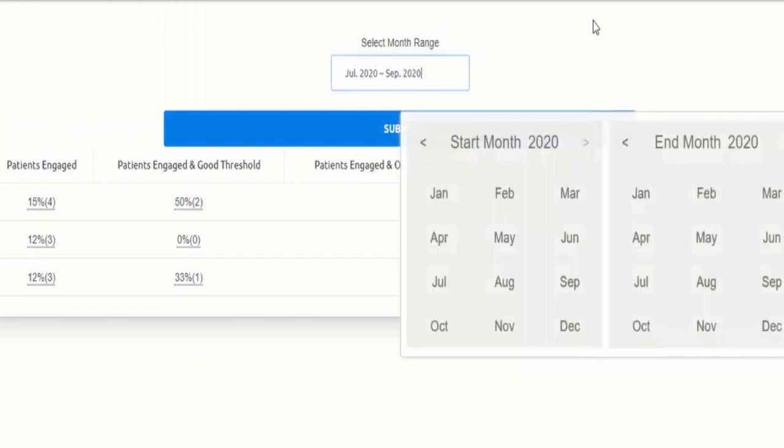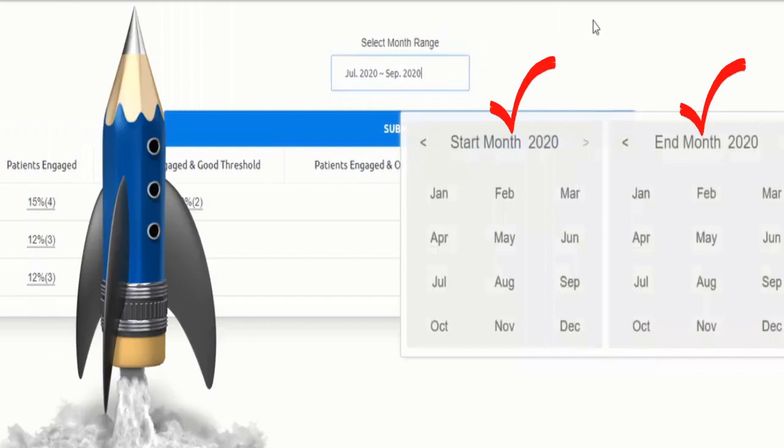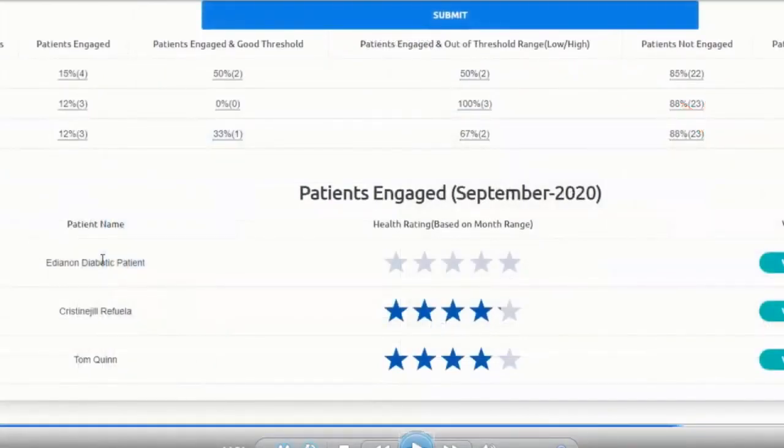The report analyzed by outcome will provide you with a statistical view of where your population stands based on the American Diabetes Association's and American Heart Association's guidelines. You simply add your date range, reading type, and sub-reading type, and now you have real-time access to where your population stands overall and individually, with the option to visit the patient profile and launch a patient monitoring session.